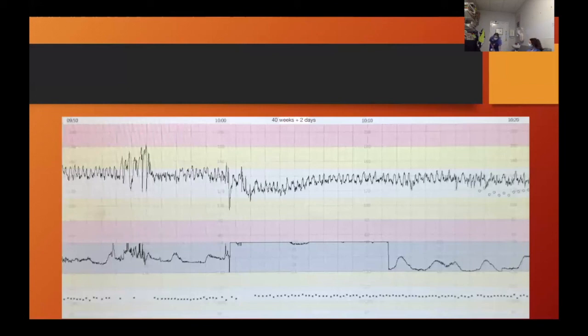Position, potentially. Do the 7 in 10 contractions help her progress? Probably not much effort, force. So they're not relaxing enough. The uterus has to contract, stretch the cervix, and then relax to allow the cervix to stretch. If it keeps on cramping, those don't help. So the reality is, if you try and relax this uterus, you may end up with better progress than forcing the contractions to be stronger. You will also end up with a happier baby. Yeah?